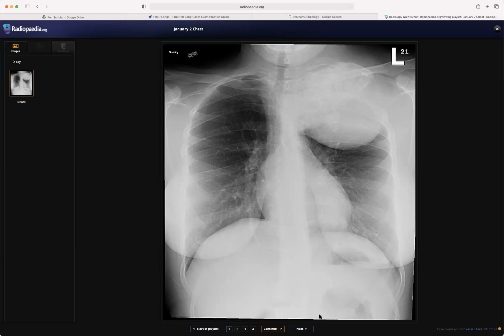I would like to look at the clinical details of the patient before getting into a diagnosis, and also look at any prior imaging if available. If none is available, and assuming this to be a malignant lesion, I would like to proceed with a CT thorax, abdomen, and pelvis, and will alert the tumor tracker also. Okay, very well. So next case.